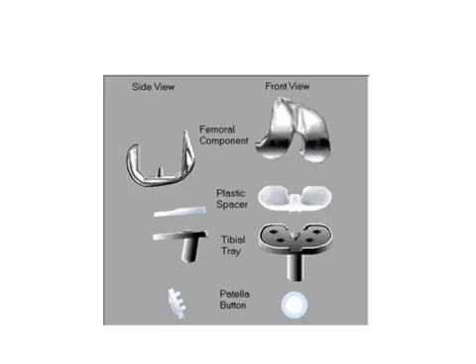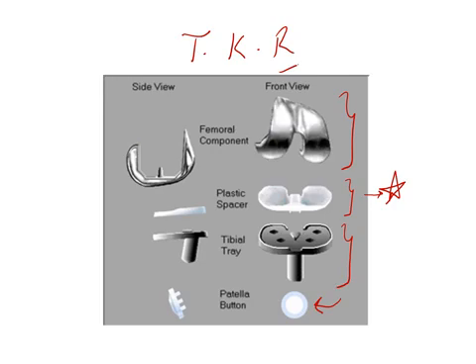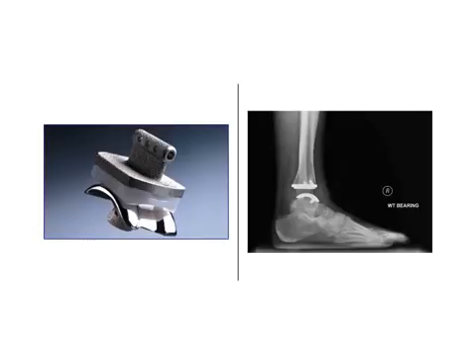This is total knee replacement. In total knee replacement, we have a femoral component, we have a tibial component, we have the intervening plastic spacer which substitutes for the meniscal layer in between, and then we have the patella which is replacing the patella for the patellofemoral articulation. This is total knee replacement. I believe they can ask you any component out of it. I'm telling you two more varieties of replacement, although rarely done, but you must know the implants.